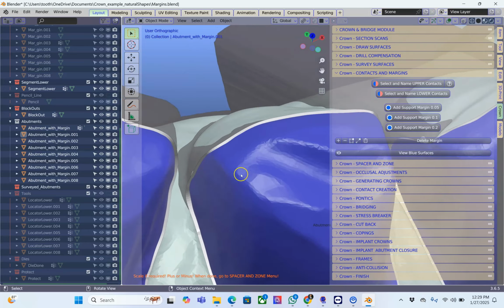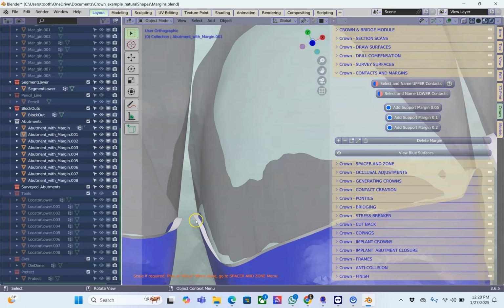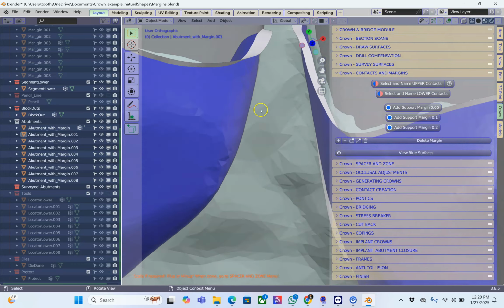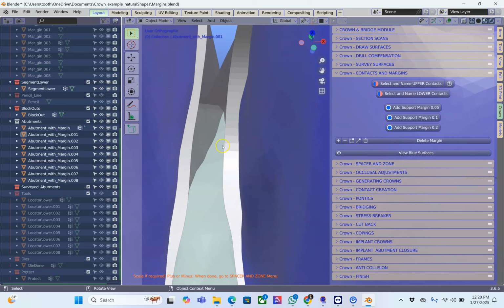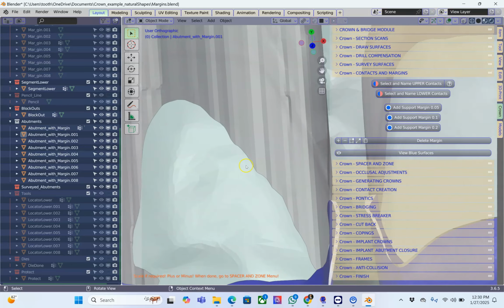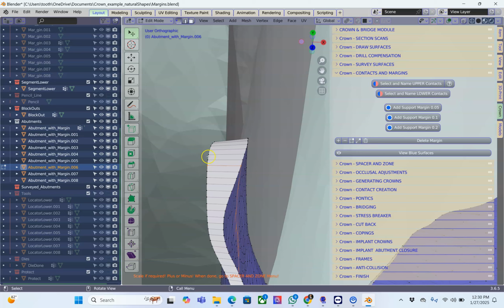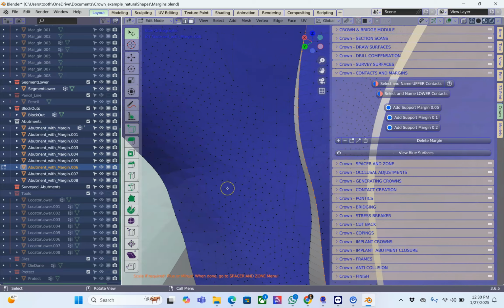So here it's actually brought this margin out to the perimeter of this blocked out object, and so it has done over here. Here it comes out a little bit wider because that's where the block out comes. So the margin of this will always be on the outside of the blocking out, as you can see over here.